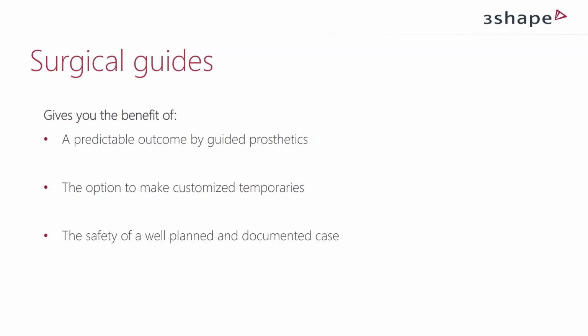One more benefit is that a dentist or an oral surgeon, for them it's very important to be able to follow all the steps of our treatment, even before the actual surgery. The Implant Studio Planner and Guide Designer provides special reports both for how the planning was performed, as well as drill guide or drill instructions for how the surgeon can do this. These reports even contain different order numbers for all the products that are included in the surgery, so they can successfully order the right components.